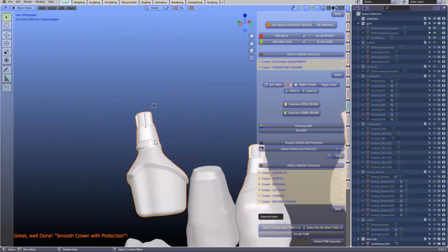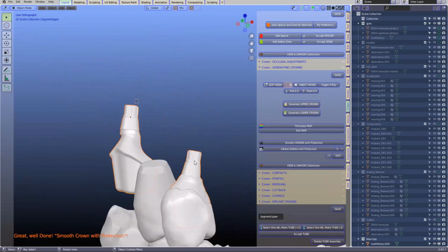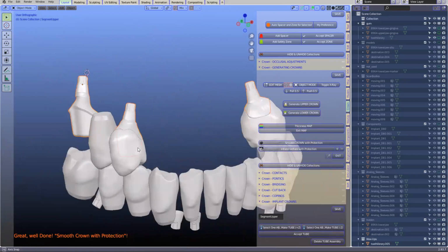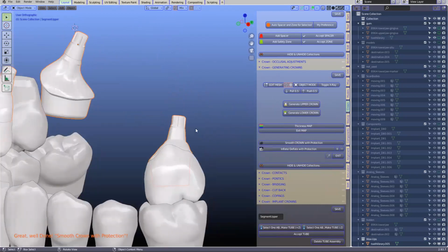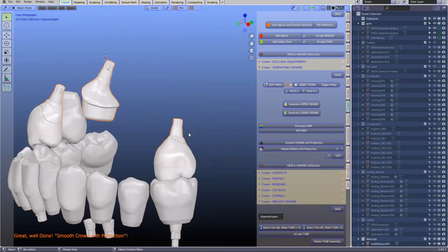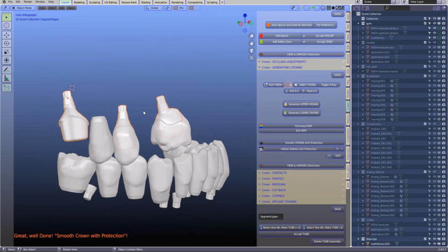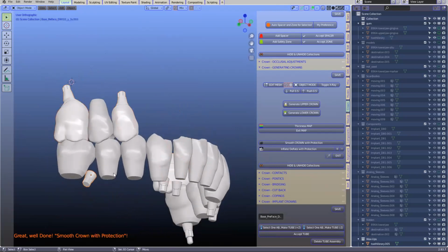Now I may have lost my orientation. I may not have. I'm not sure. Let's just have a look. Yeah, I could have lost my orientation because we need that to bring that in. We should have done that beforehand. So maybe it's good not to delete that, because then we can use that one, otherwise the coordination is lost. So you'll be able then to fit that over to check the dimensions.